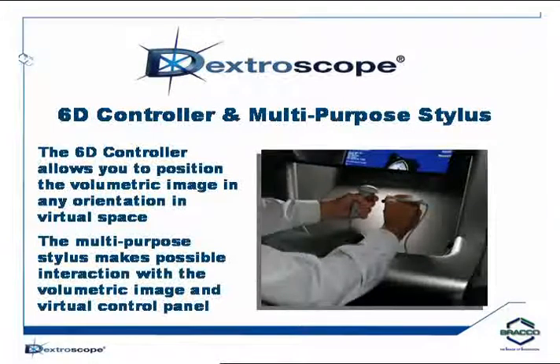Your left hand holds this 6-dimensional controller, 6 degrees of freedom, and it's being tracked in space by a 3D tracking device, so it knows exactly where you are in space at any time, and the orientation. And the right hand holds this stylus that you can operate all of the various controls with.